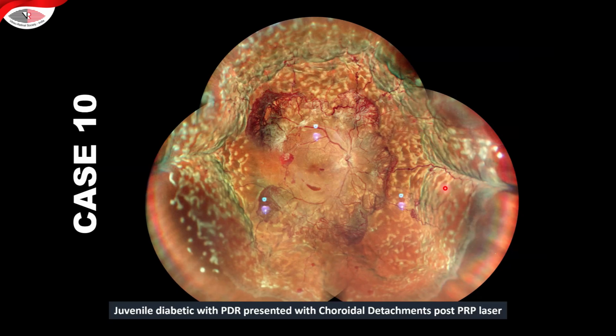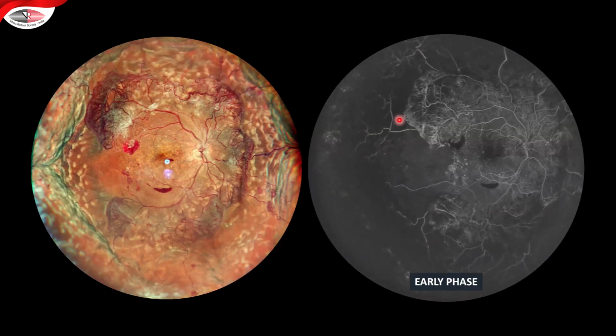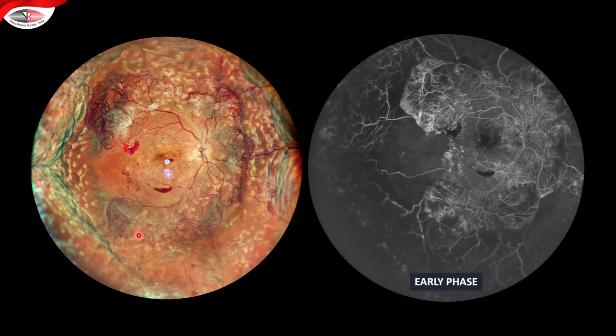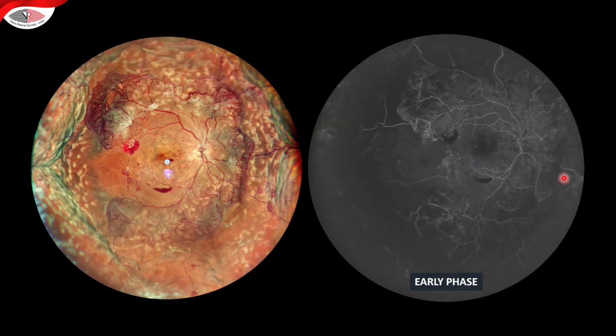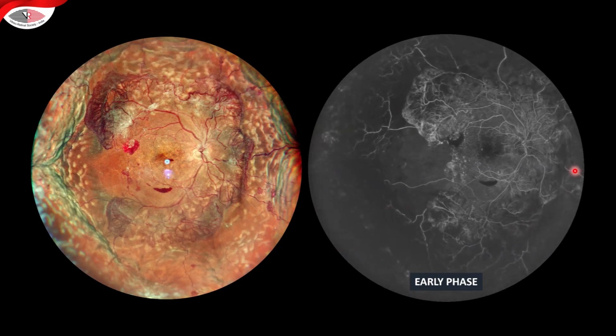So this is a wide field image of a patient who had recently undergone laser, and we did angiography in this patient, and you can see what it looks like. There's extensive ischemia just beyond the arcades where this florid new vessels is, and of course you see the fresh laser marks which are manifesting. And of course, there's so much choroidal effusion that the whole picture is not very clear.